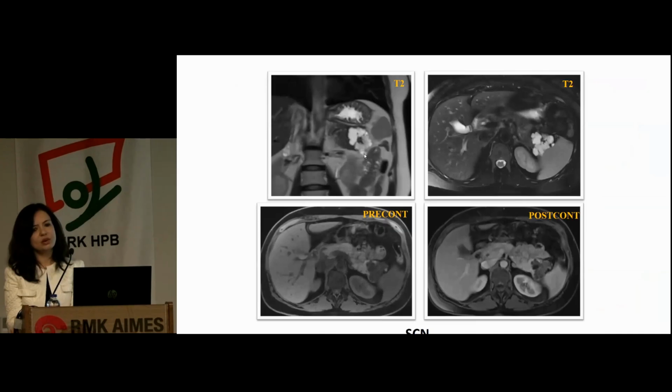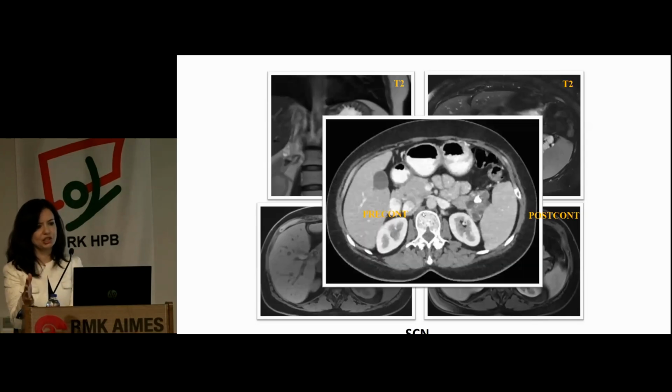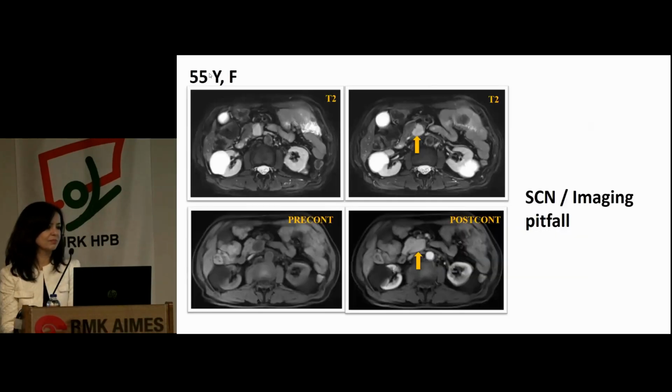This is an oligocystic or macrocystic variant where you can see fewer cystic locules and they are larger, bright on T2. Please note the outer contours are very lobulated, different from MCN. And there is a very, very dark central stellate scar on T2. Very dark on T2 means calcification, which was further confirmed with CT. CT sometimes helps us to confirm calcifications.